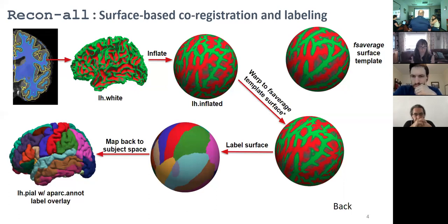So it does have an impact. For instance, on the lateral surface of the brain, you typically have a central sulcus, a precentral sulcus, and a postcentral sulcus. Every once in a while, you have an extra sulcus in here, and that really throws it off. So you have to keep an eye on that.